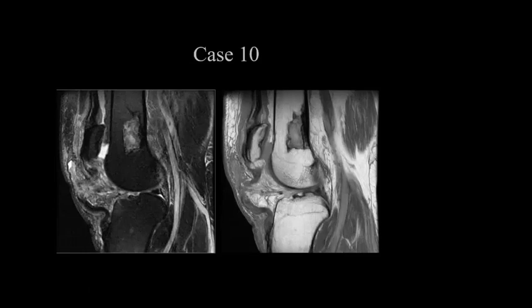Okay, so I don't know if you remember from the bone tumor talk we had. We said if there is an intramedullary lesion with geographic line, medullary infarction. Yes, bone marrow infarction. So if we try and combine these together, bone marrow infarction and patellar tendon rupture, what do you think is the cause of this patient's problem, to explain both?